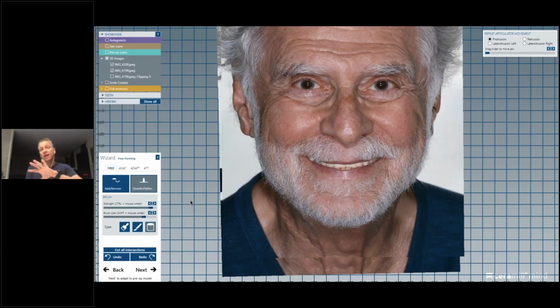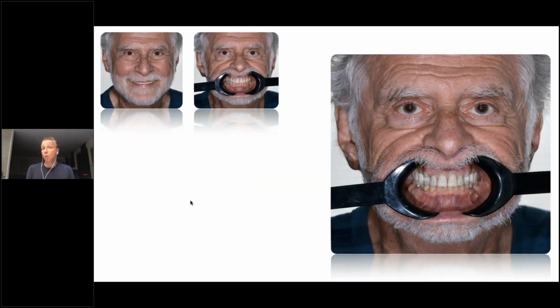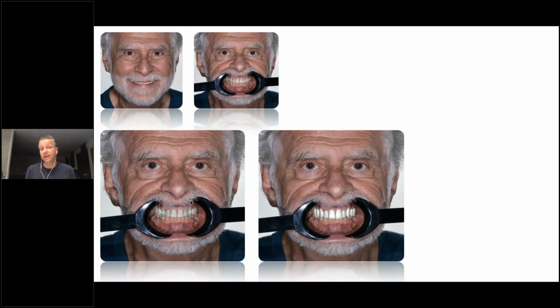So in this patient, we're concentrating more on his smile, and we see that negative V basically. So now, in the centrals, we can transfer that picture into our M-Smile module, into our Ceramill Mind software, and we can start creating a smile. So you see, I'm popping in here now molds, tooth molds. I will go step by step through that process over the presentation a little bit more in detail. But just for that page to see now, I'm popping in more square teeth. I personally think they're a little bit big, but that's what he liked. That's what he was asking for.